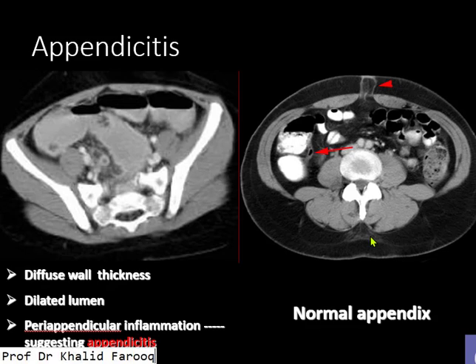Here we have CT examination. We can see this is a normal abdominal CT. With respect to the appendix, we can see a very smooth and thin walled appendix. A tiny air pocket is noted within it and surrounding fat planes are preserved with the normal fat. Contrast is noted in the cecum and in the adjacent small bowel. A small paraumbilical omental hernia is noted.